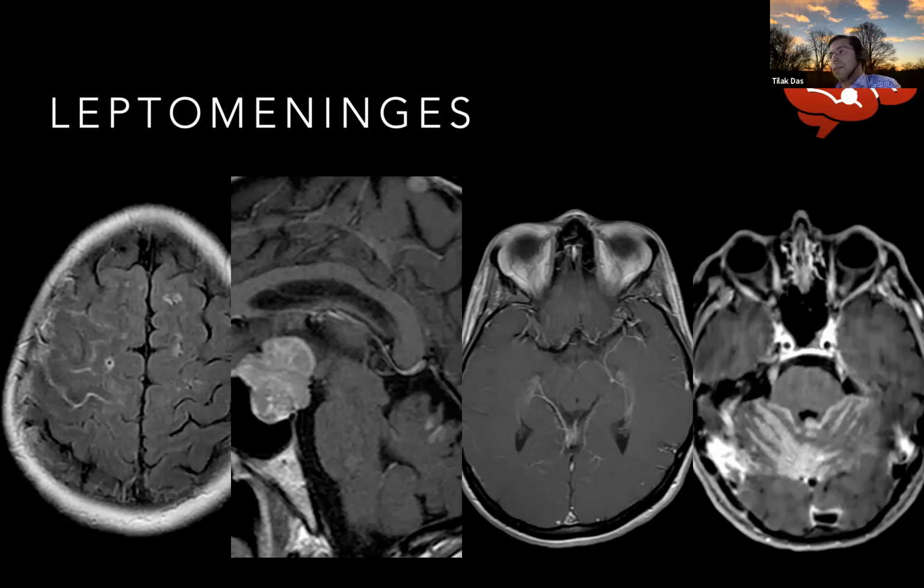And for each case, if you could answer yes or no. Oh, sorry, it's even simpler than that. Which cases do you think are cancer? Is it case 9, 10, 11, or 12?